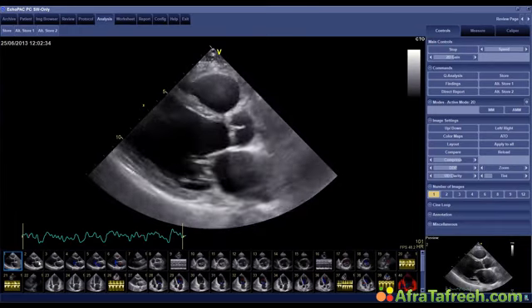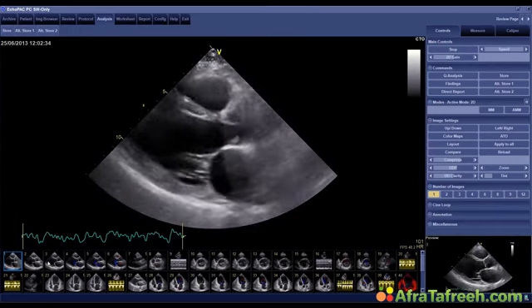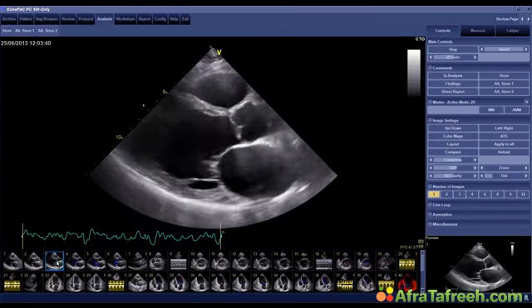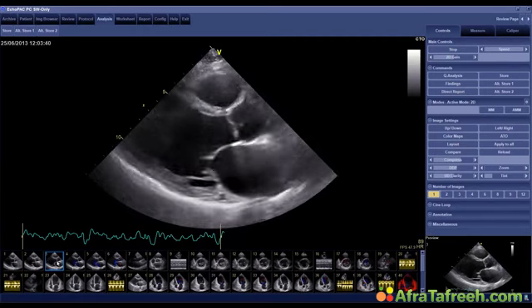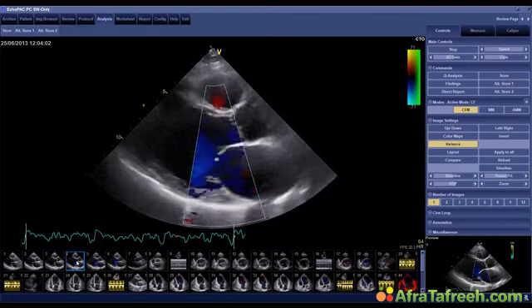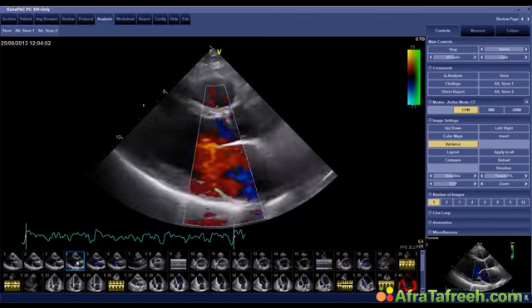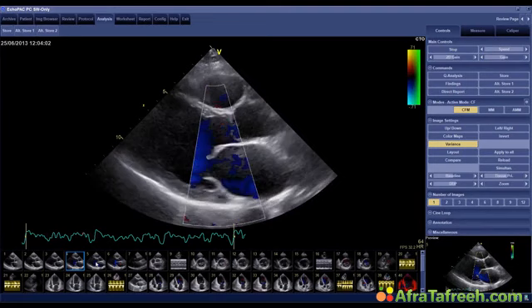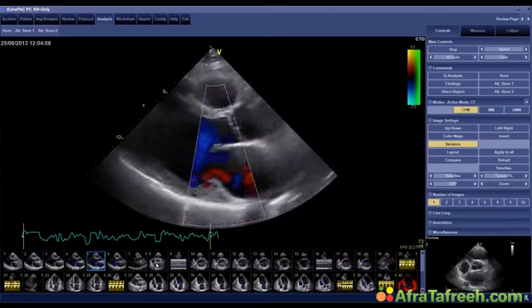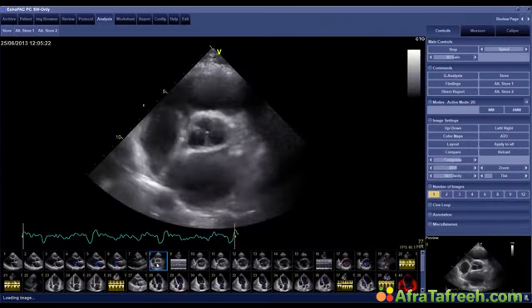Before I do so, let me just click through the images, and I want you to try to pick up the information, and decide what you think is the prognosis of the patient, what you think the symptoms of the patient are, and ultimately what we could do with the patient.